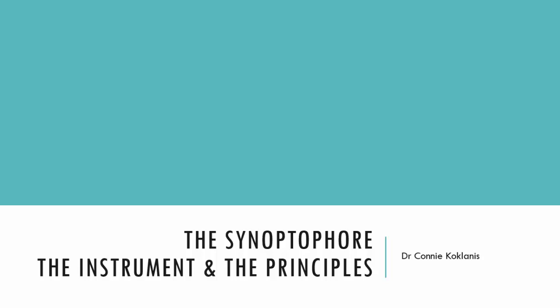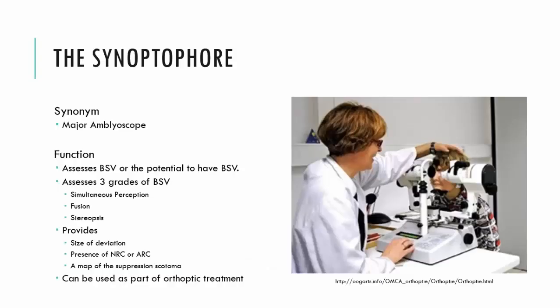This is the first video in a series of videos where we'll discuss the Synoptophore. We'll start off with talking about the instrument itself and its principles, and then move on to how we set up a patient on the Synoptophore, how we investigate a patient's binocular single vision on the Synoptophore, and then also how to go about interpreting the results from a Synoptophore. Let's start off talking about the instrument.